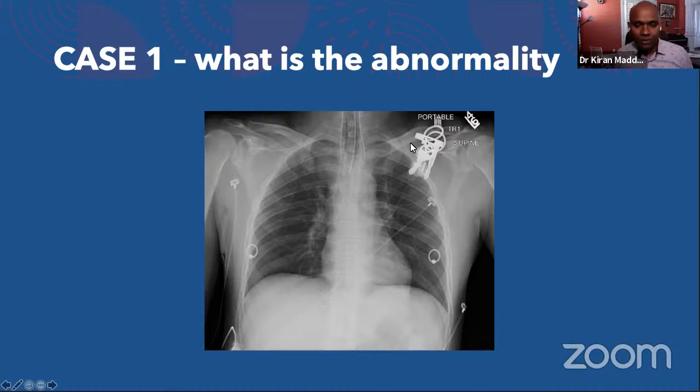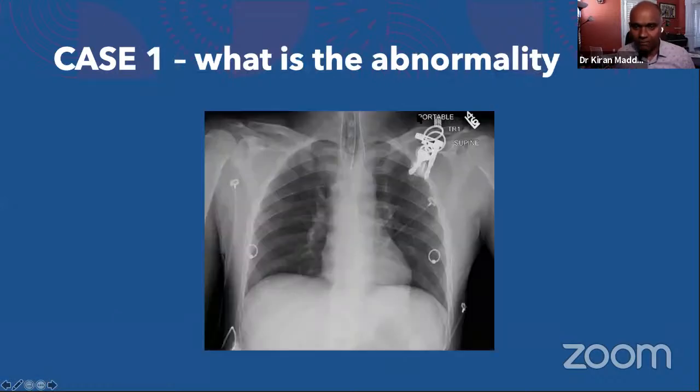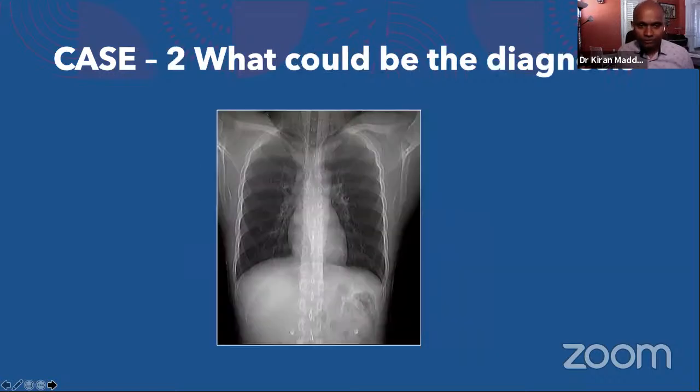Don't jump into diagnoses, like, hey, this may be a case of pneumothorax or pleural effusion. Instead, pay attention to what exactly the radiograph reads like. For example, a portable is taken at the bedside when the patient is still on the bed. The radiographer or technician takes the X-ray machine there and shoots a film there. That's how it works. This is case 1 for you.